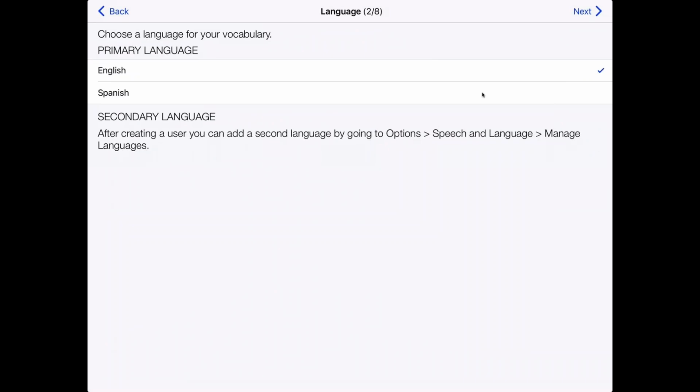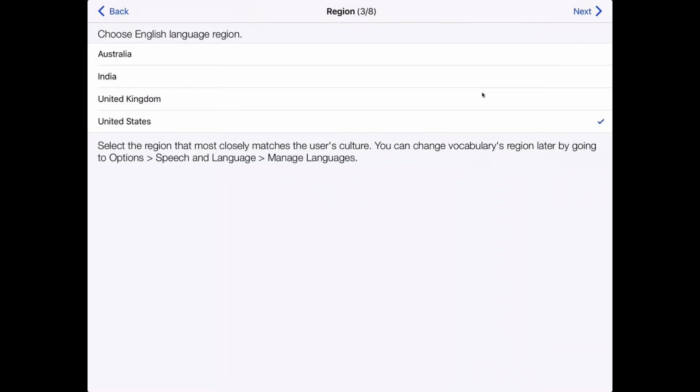We do have a webinar on our website that will go into a lot of detail about bilingual. So we have, well actually we have 3 different versions of English. One customized for Australia, the UK, and the United States, and if you select India, you actually get the UK. I'm going to pick the United States, and if you're Canadian, probably you would pick the United States as well.